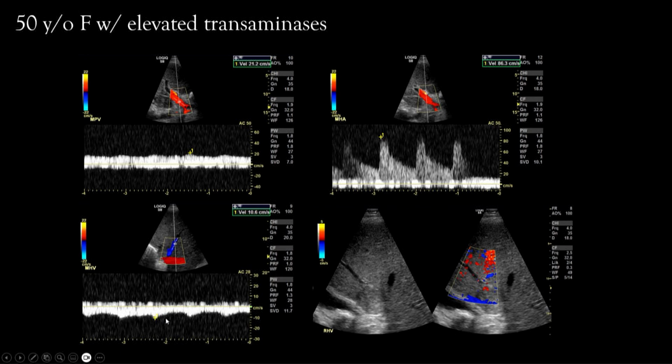continuous antegrade flow, with maybe a little bit of pulsatility in there, but not much of a difference over the cardiac cycle. When we see that pattern, what we think is that there's something causing a disconnect between the pressure fluctuations in the right atrium and the pressure fluctuations in the hepatic vein. Something is blocking the communication and preventing those pressure waves from being transmitted back into the hepatic vein. So in this case, we looked distally, and we saw this.